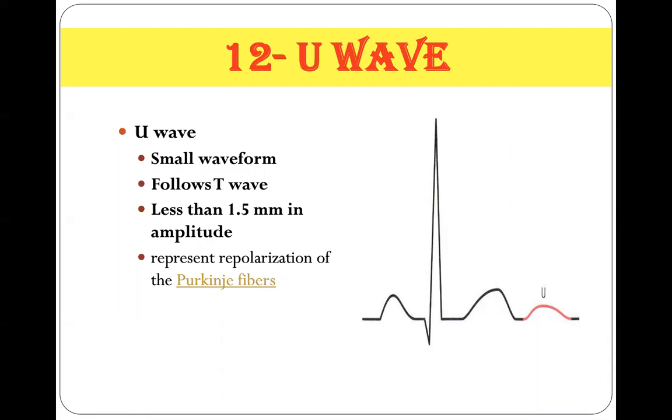I want to emphasize that when you see the U wave, it can confuse you with an abnormal P wave. So be sure to differentiate between the U wave and the next coming P wave. This is the first point.